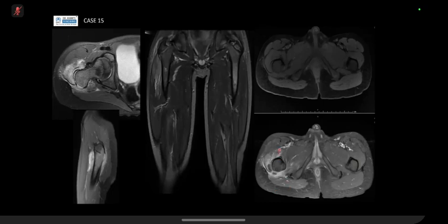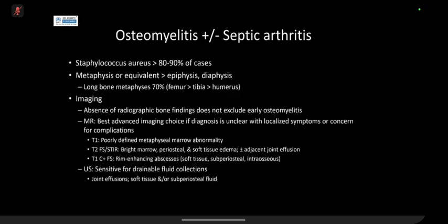Looking at these pictures in my head, there shouldn't be a differential of Ewing sarcoma, because the post-contrast findings are the giveaway. It looks like an abscess with surrounding enhancement, and the reason is that this is a cortical breakthrough from the periosteal abscess. Now, osteomyelitis can happen at different ages, so we'll just go to the next slide first.